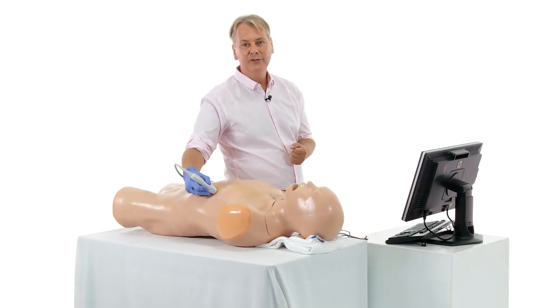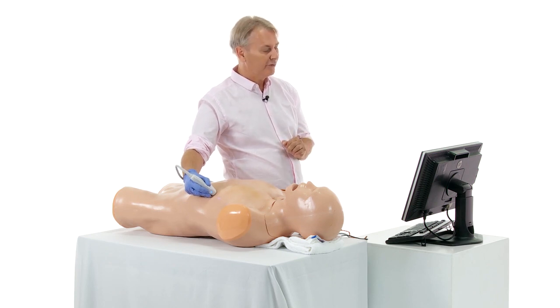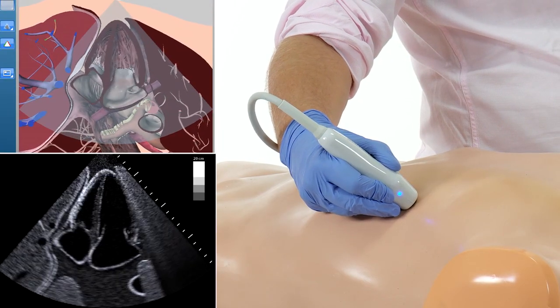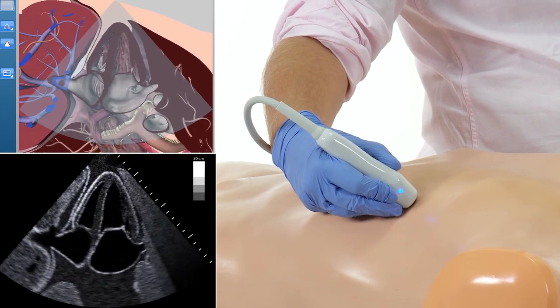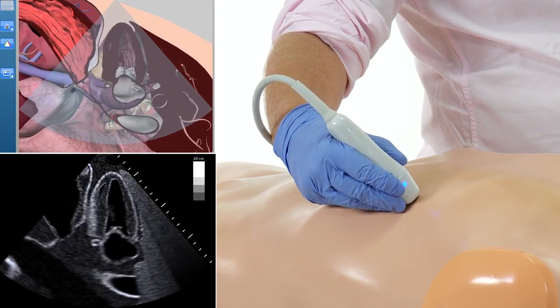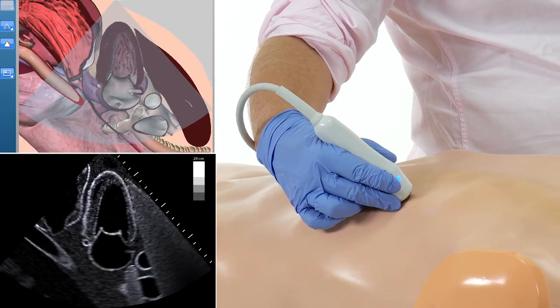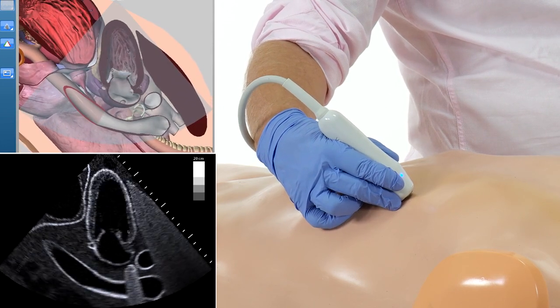Now let's take a look at the two-chamber view, this time not in a patient, but on the simulator. If you want to get to a two-chamber view from a four-chamber view, it's first of all very important to bring the left ventricle into the center of the image. Once you've achieved this, you rotate counterclockwise, and while you rotate, you try to also observe the size of the left atrium. Never lose the left atrium, otherwise you will not get into a good two-chamber view. So adapt the tilt, and then you rotate until you lose the right ventricle. In that situation, you are then in a two-chamber view.